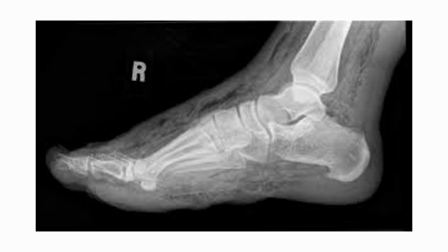After that they started worsening, and then they came to you, and when you palpated the cellulitis, you felt some subcutaneous emphysema. So you got the X-ray done, and this is now necrotizing fasciitis. This needs to be referred to the surgeons for debridement, and here the antibiotics will be your piperacillin tazobactam plus clindamycin, and should be appropriately referred to surgeons.